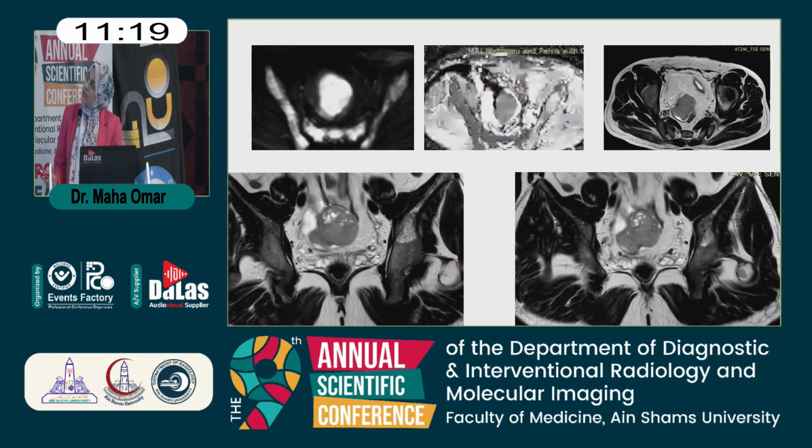As we can see here in the diffusion weighted images, we have a pelvic mass that has true diffusion restriction. In the T2 images, the axial and the coronal, we can see this lesion originating from the distal ileal bowel loop as an endophytic component and a larger exophytic component. And there is mild proximal dilatation of the distal ileal bowel loop seen here.